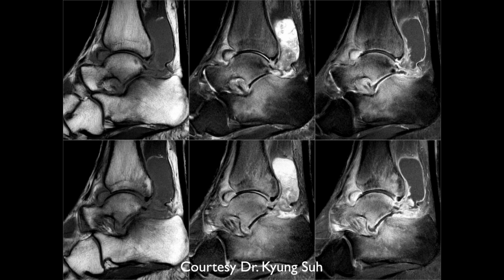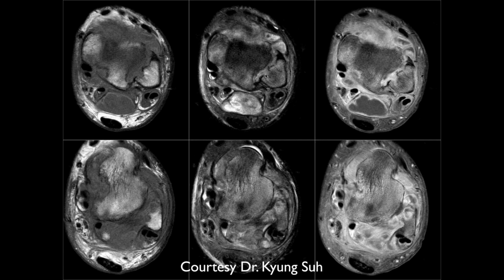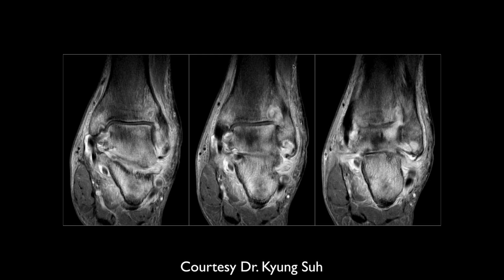Looks like there's a big, I don't know, is that within the muscle or no? Soleus? No, that just looks like there's a soft tissue abscess extending from the joint. It's enhancing, and there's a lot of edema of the talus and tibial plafond posteriorly. I'd be worried about early osteomyelitis, and you can see some erosions too on the T1. Yeah, and also of the fibula. That lucency on the radiograph is much clearer on the MRI. What do you think the organism is?